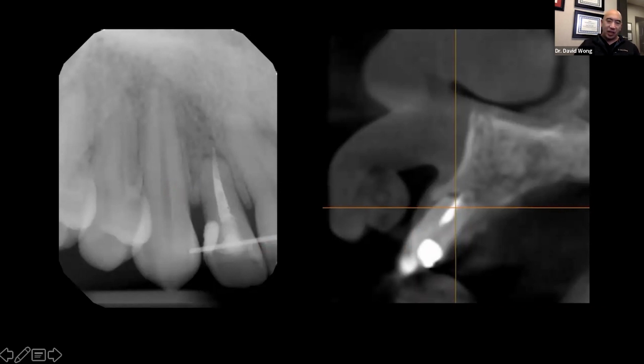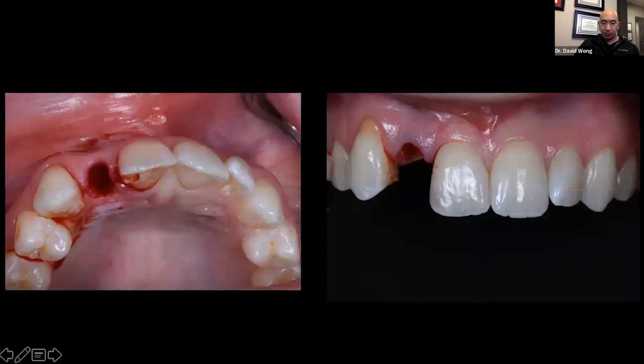When you look at it, you can see the facial lingual width is great. We have a short root, so we can actually engage a lot of native bone with our implant. So this right here, ideal. Okay. Outside of the tooth morphology, which I don't like, the bone situation is awesome. I mean, you've got a big target. You follow the 3-2 rule. Looks really, really good. You're going to have good primary stability.